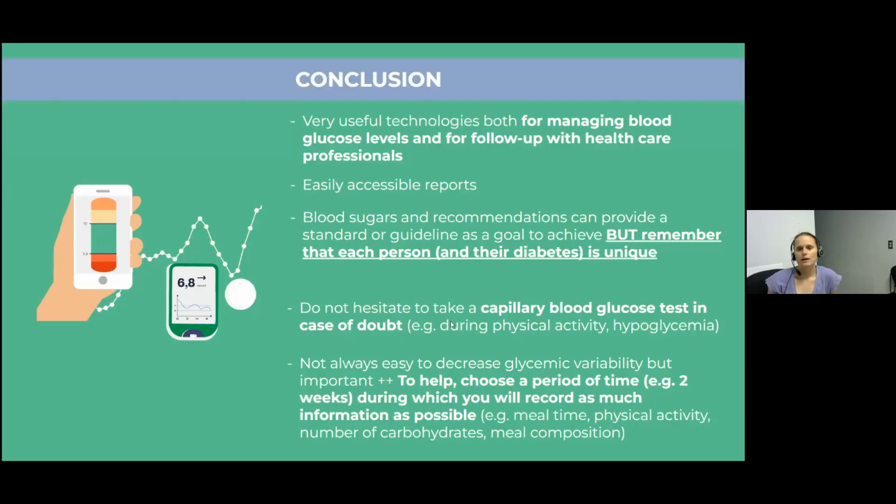So to conclude, I want to say that we can see that the CGM technology is very useful, has a lot of advantages for managing blood glucose levels, but also for having good follow-up and good care with our healthcare team. The reports are really easily accessible, so I really encourage you to go and look at them sometimes to help you with your blood glucose control and management on a daily basis.